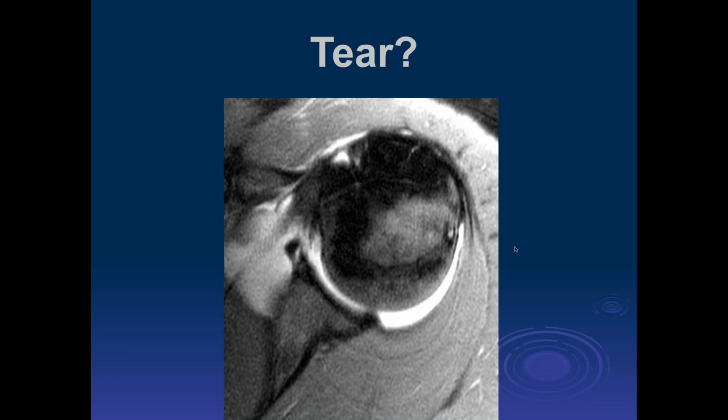Okay, now this was a potential number one draft choice. This was the axial MR scan through the shoulder, because the patient was asymptomatic, but the team got an MR scan. And the question asked of me is, is there a labral tear here? Because it was called a labral tear, and a lot of teams decided they weren't going to draft someone who had a labral tear. So what do you think? I see a thin, hyperintense linear focus in the anterior labrum.